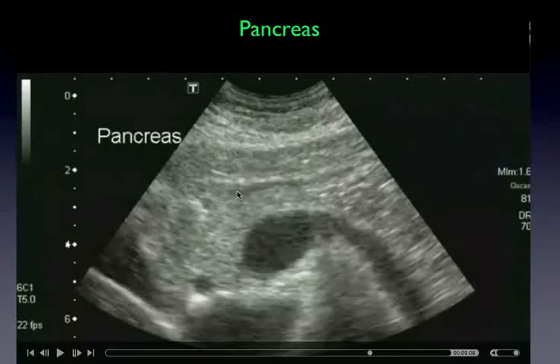And they thought this was the duct of Wirsung, the pancreatic duct. And the answer is no, I don't think it is. Why? Because if you look at the margins of the pancreas, it seems to come across here, and then it comes down over here. So this is outside the plane of the pancreas. How is this duct going this way when the pancreas, we know, slides down this way?